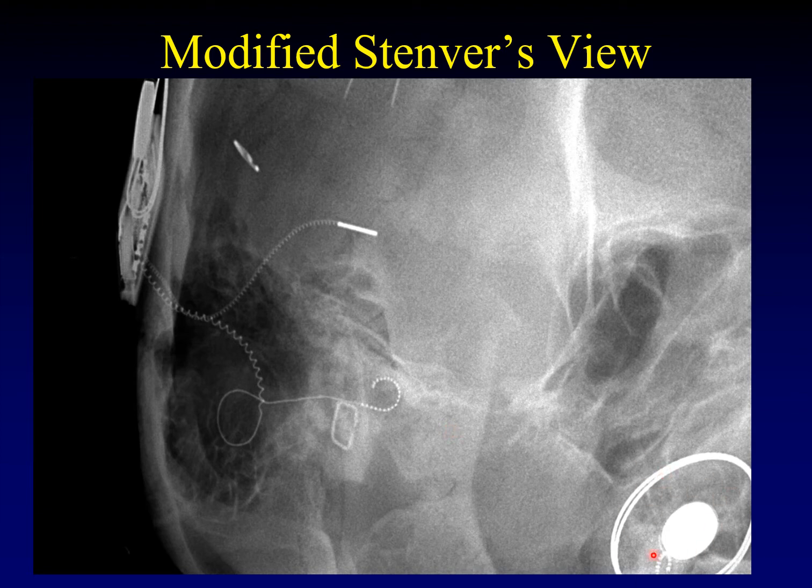This, by the way, is the contralateral cochlear implant in this patient. You can see the oval window is right about here. And so you can see that the majority of these electrodes are completely within the cochlea. The idea is to count the number of electrodes that are successfully implanted and to communicate how many turns of the cochlea have lead in it.